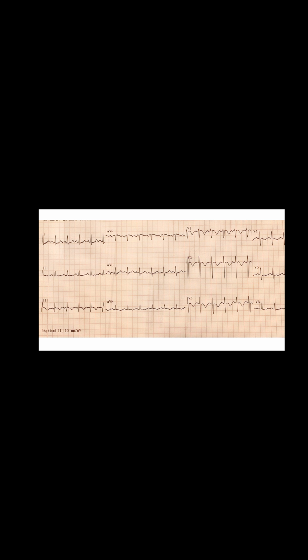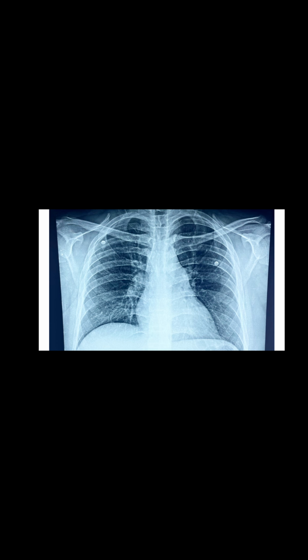So I ordered his chest X-ray to rule out any lung pathology. Here is the X-ray of this patient. In this X-ray, there is prominent right pulmonary artery with somewhat increased shadow of right heart.